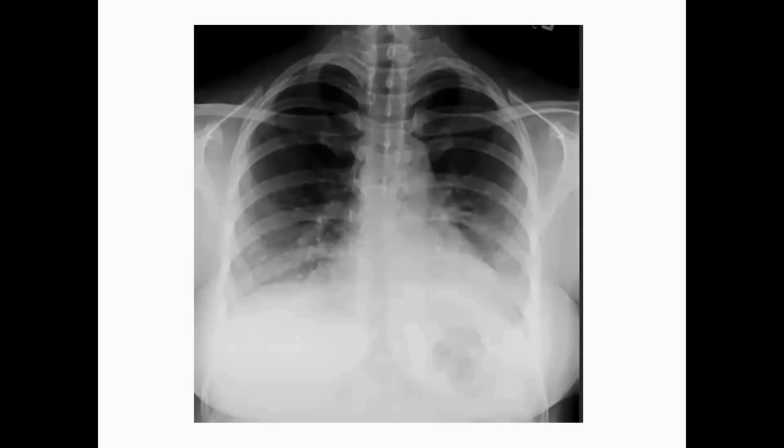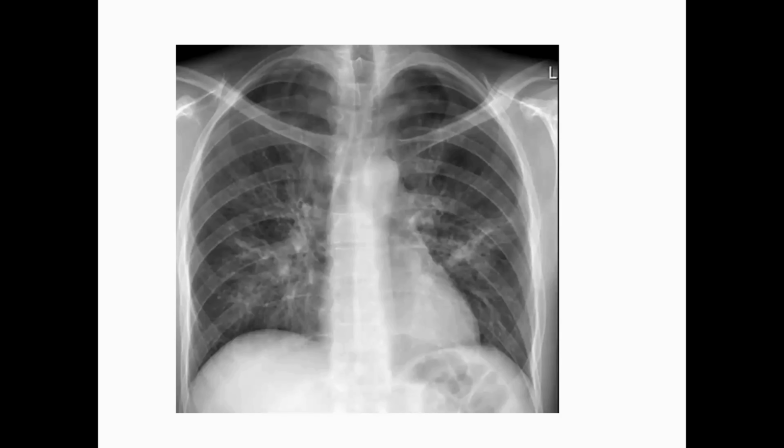The second thing is that it is not of lobar or segmental distribution. Suppose this X-ray: the patient came unwell, with the same high inflammatory markers, and the patient is confused. If you see the chest X-ray, we'll see patchy consolidation in both mid zones. Why do I say patchy consolidation? Because this is not a consolidation involving one lobar or segmental area.